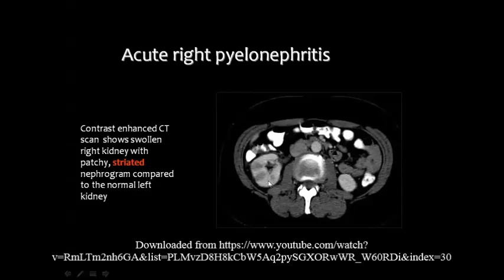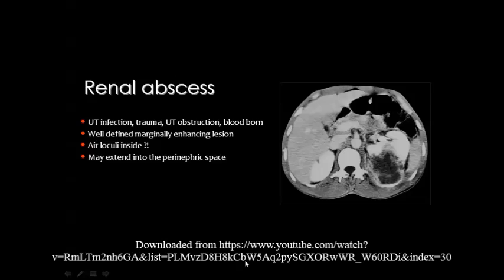Parts of the kidney excrete contrast, part does not excrete contrast. And sometimes you get an abscess in the kidney or in the perinephric space, and the abscess is just a well-defined lesion filled with pus with enhancing margin all around. And this is diagnostic of an abscess.